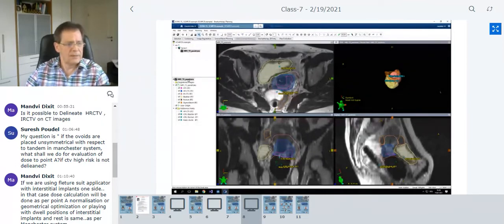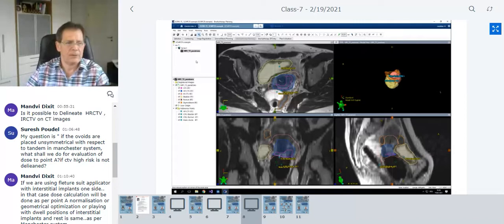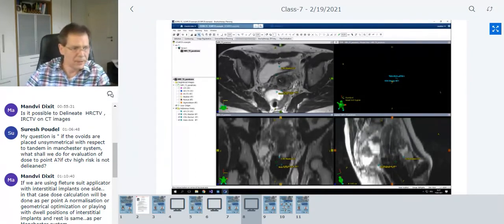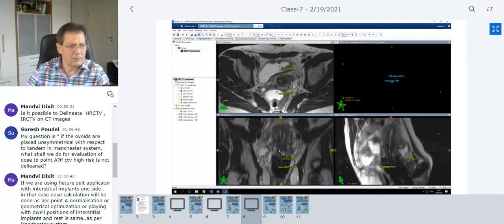This is a T2 weighted MRI image. This is, let's say, for the doctor, the primary image where they contour the target and organs at risk. For the physicist who has to define the applicator, it might not be the best choice, because if we look at where we see the applicator, and I just deactivate the contours for a minute, okay, we can see the applicator. If I go, let's say, in the center of the intrauterine probe, we see here is the uterus. And if I go to the frontal image, we see here is an applicator, we see the uterus, we see the ring channel.